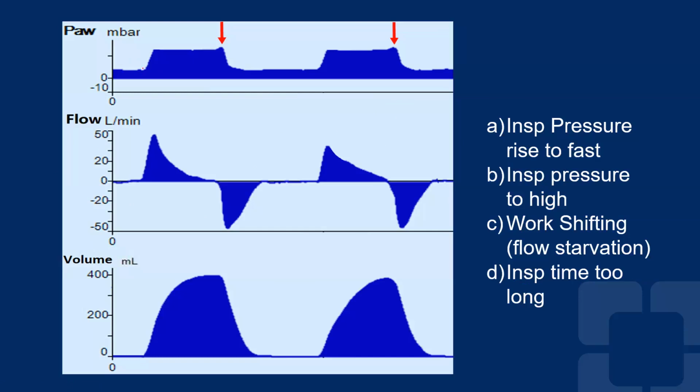If you're talking about cycling, that peak at the end of the breath will usually come, when it's a late cycle, with a little pause that you see on the flow, the zero flow, and then the passive exhalation would occur. You could potentially say that you see it here. It looks like a really passive breath, this one less passive, and perhaps some.